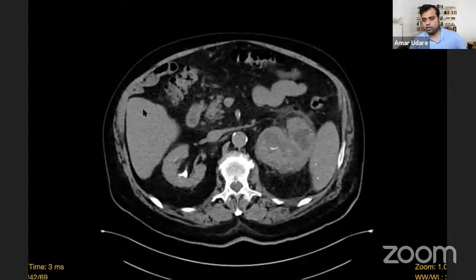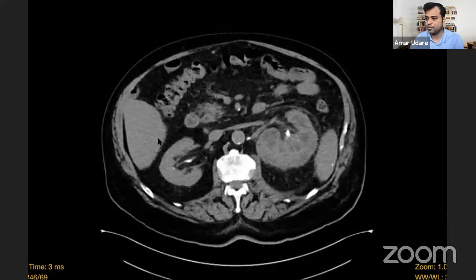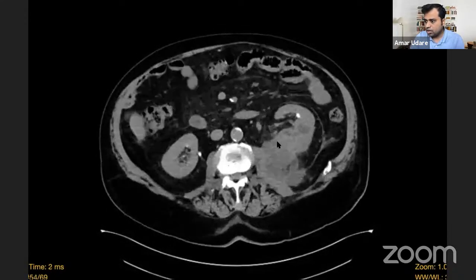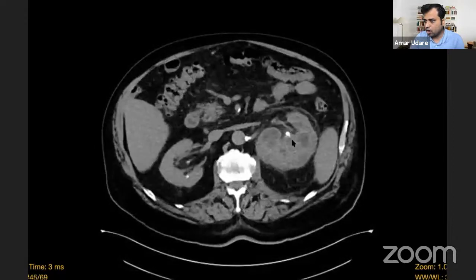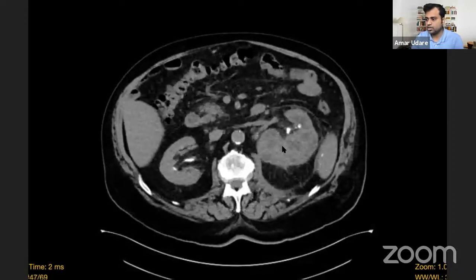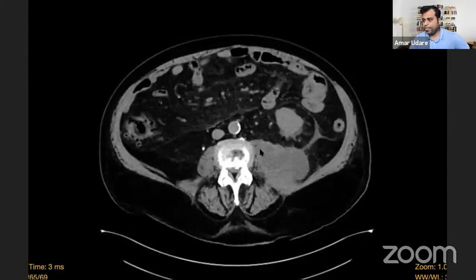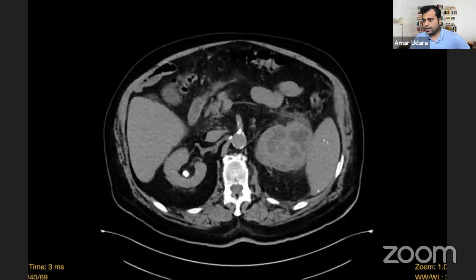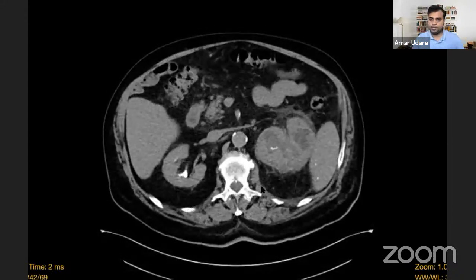Osteomyelitis, yes, for Ram, for the previous case, we did think of that as a differential. That's the reason why the patient underwent a biopsy, and it turned out to be an eosinophilic granuloma. Okay, apologies for this, because the contrast in the collecting system makes it a bit difficult to diagnose the pathology. But this is the representative image.